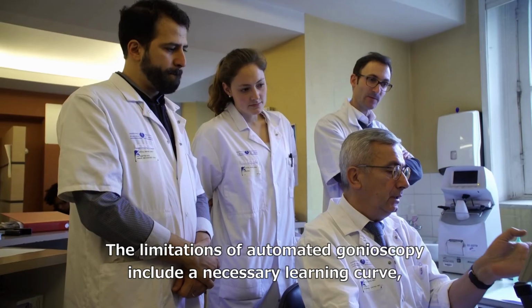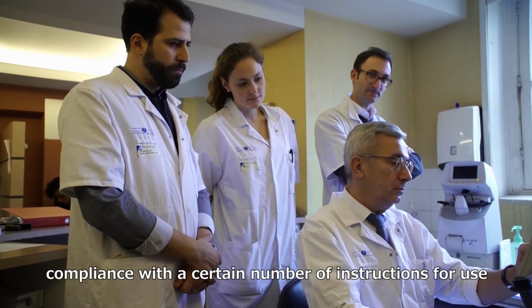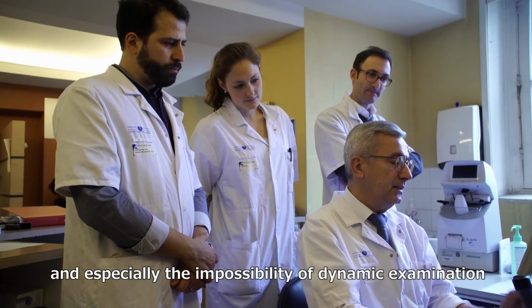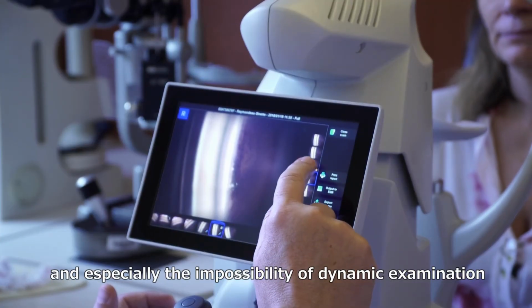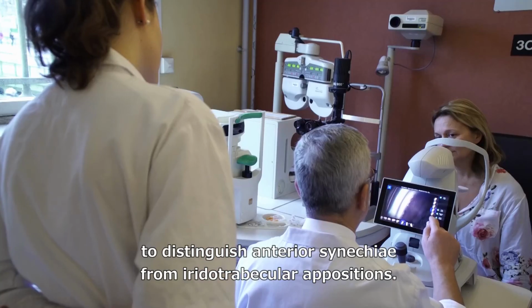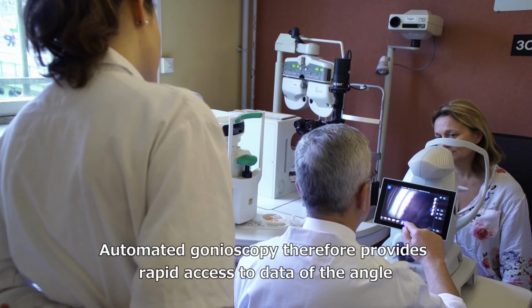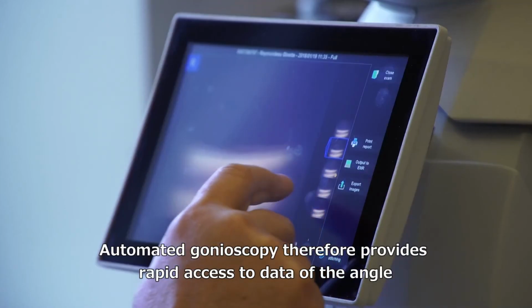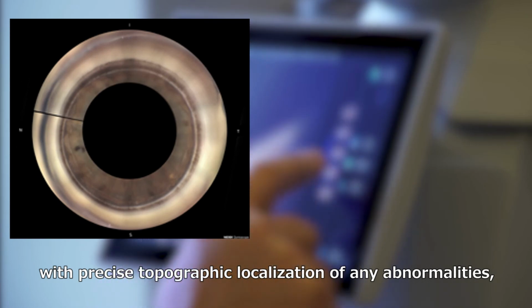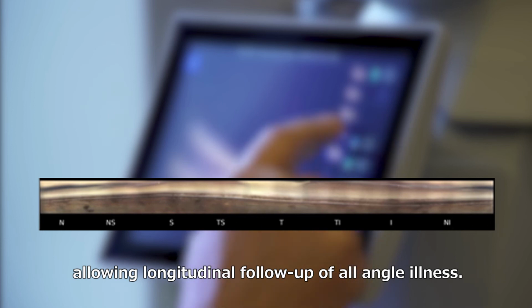The limitations of automated gonioscopy include a necessary learning curve, compliance with a certain number of instructions for use, and especially the impossibility of dynamic examination to distinguish anterior synechia from iridotrabecular apposition. Automated gonioscopy therefore provides rapid access to data of the angle, with precise topographic localization of any abnormalities, and a longitudinal follow-up of all angular illness.